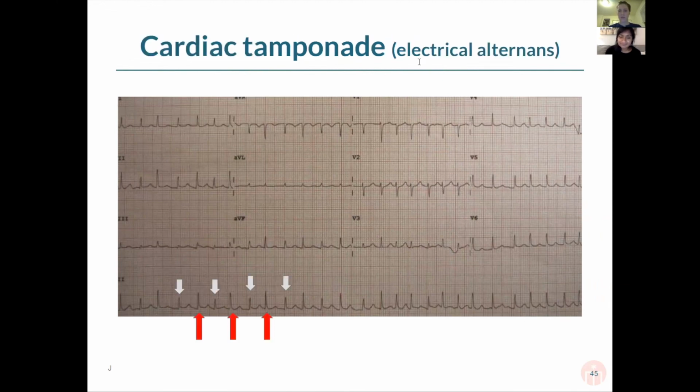This is cardiac tamponade. And you see the classical electrical, and someone said Beck's triad, that's great, but classical electrical alternans on the EKG. In particular, you see the arrows down here where the QRS complexes are changing in amplitude, high, low, high, low. They're alternating back and forth, and that corresponds to basically the heart swinging back and forth in its pericardial sac, which is where you get those changes.